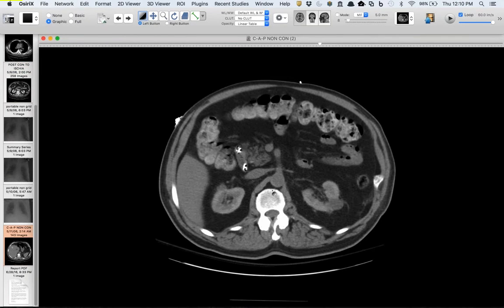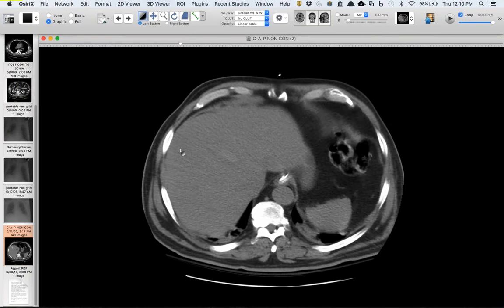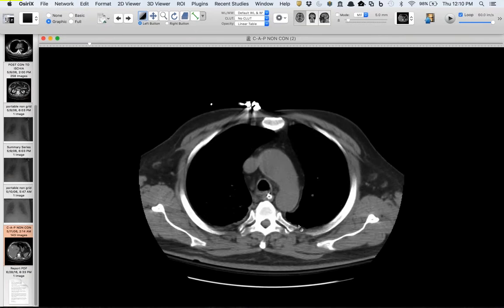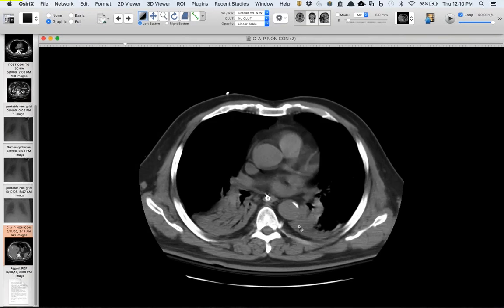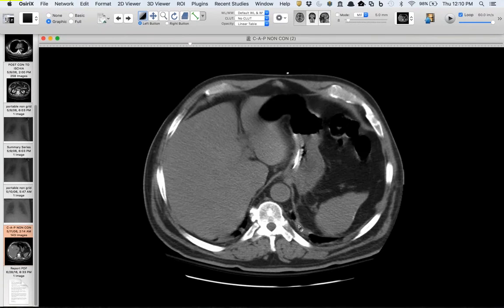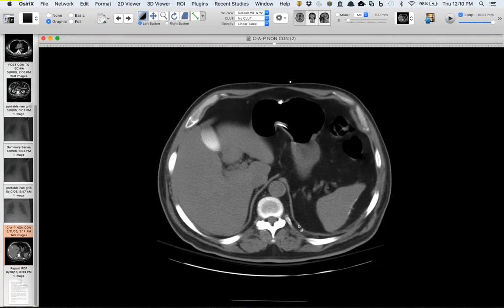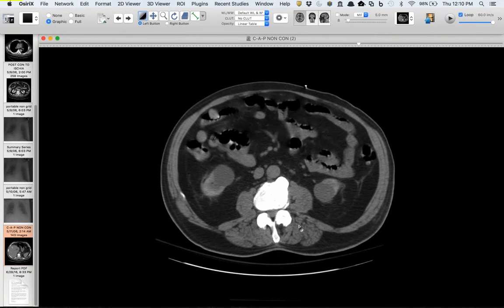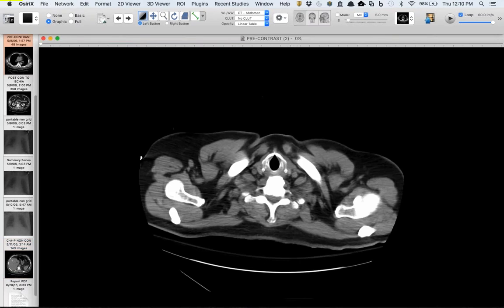So this is a few days later. I think this was 2 days after the study, and you can see that the intravenous contrast is already almost completely resorbed, and there's not really much there in terms of a dissection. So I thought that was a nice intramural iatrogenic hematoma with a test injection. A test injection? What's that? The volume of contrast is from a test injection. Then they realized and confirmed that things were not right.